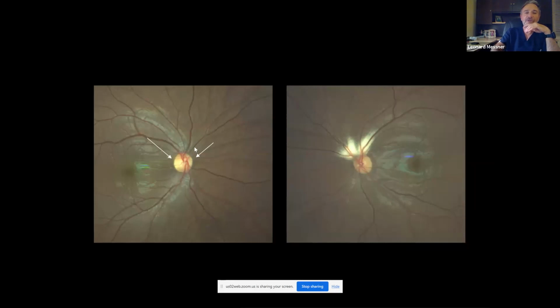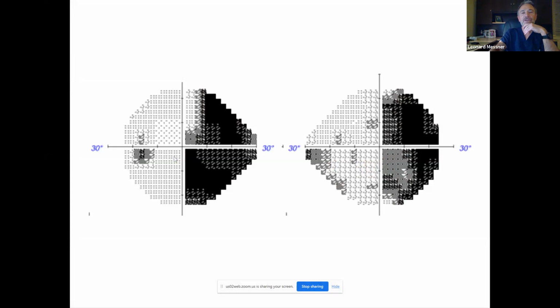And it is the signature of a contralateral optic tract lesion. You're going to get an afferent pupillary defect in the eye with the bow tie atrophy. And when we look at the brain, we expect to see a contralateral optic tract lesion. So this is involving the right eye. That means we would expect to see a tract lesion on the left side, which would produce a right homonymous hemianopia. And here are the visual fields. You can see that there is a right homonymous hemianopia.